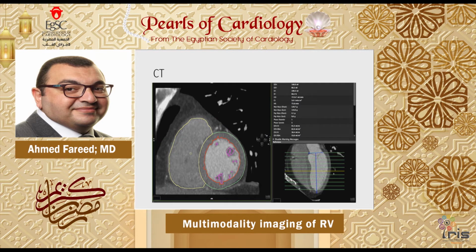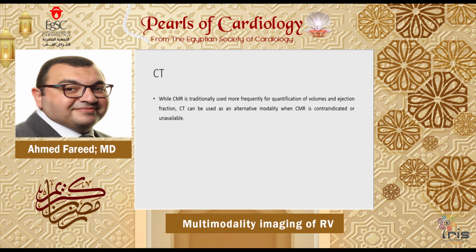And these are examples of some of the images from the CT. You can see here, you can measure the volumes accurately, and you can calculate an ejection fraction from these volumes. And while CMR is traditionally used more frequently for quantification of volumes and ejection fraction, CT can be used as an alternative modality when CMR is contraindicated or unavailable.